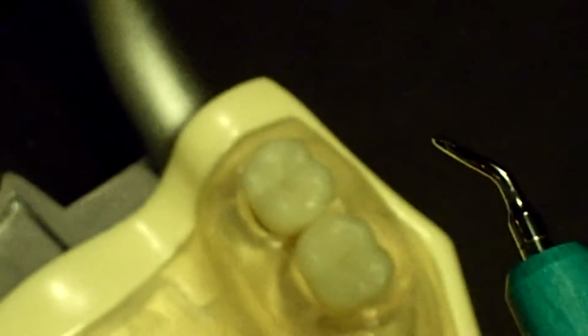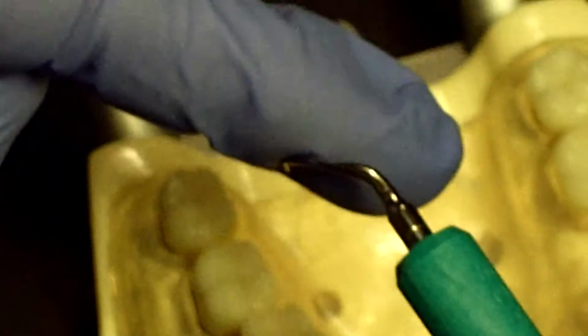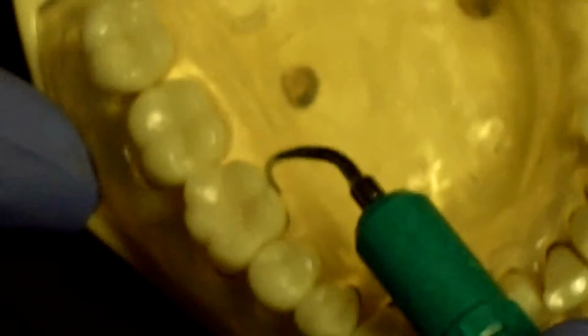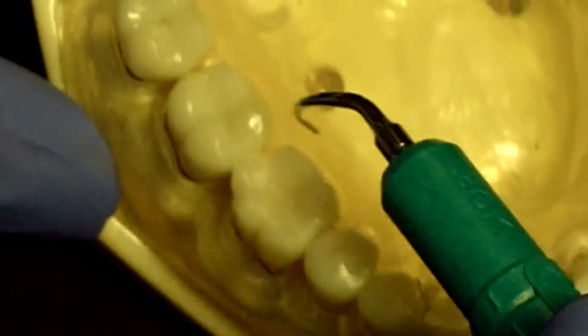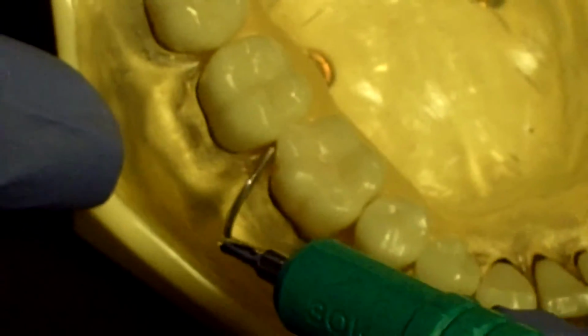That's the left insert, but truly it's more important to understand the anatomy of the insert, the shape, the design. This is the face here, and that's the back, the convex back, lateral sides. 2 approaches for the curved insert: vertical or perio, transverse for supra.